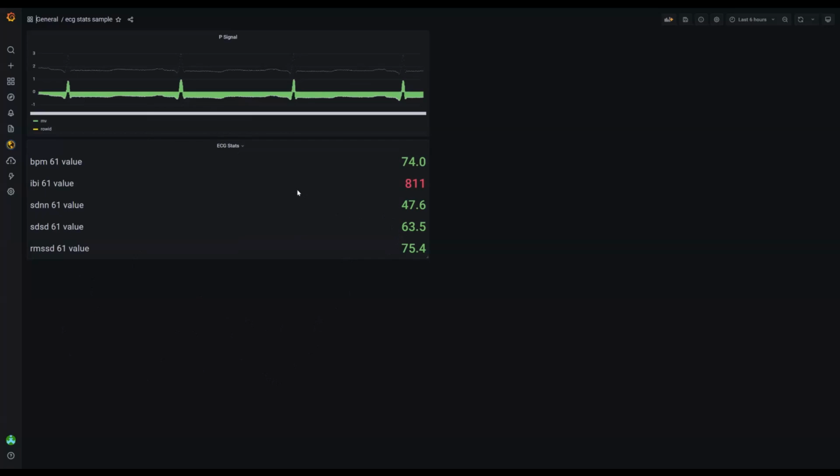Next, we will move from the templating phase to the automation phase. We will use S3 for now, since the current Deep House UI doesn't have support for S3 yet, but we do have that in our plan to make it completely go through the Deep House UI.